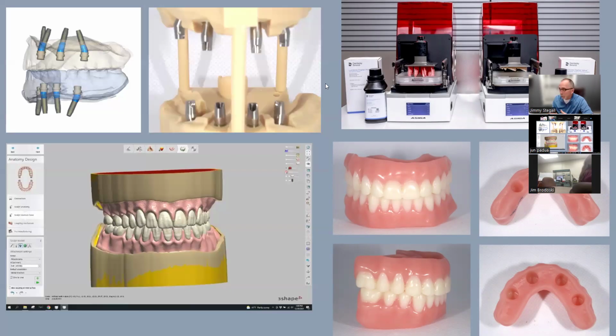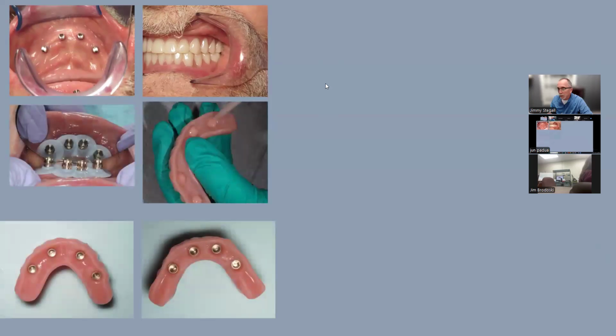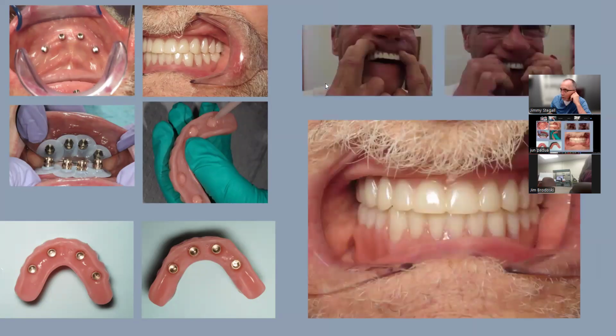So with a couple of reference dentures, we design these two dentures, use that same cylinder tool to create the recesses, and then pick those attachments up chair side or in a jig press, right? But chair side's still my favorite. And that's all done in two appointments. The first appointment was scanning the denture and scanning in the mouth with the flows. The second appointment was delivering a couple of new dentures or retrofitting the existing dentures.